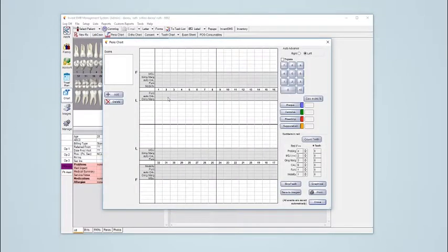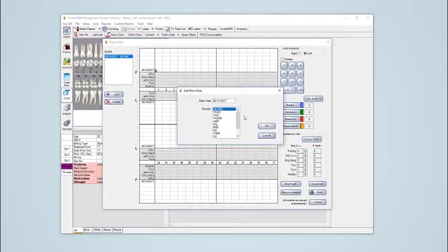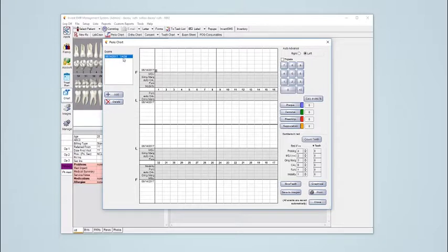I'm going to go ahead and click. On the very left hand side, you've got this box that will have the examination dates. So if you click on this, it will give you the date in which the first periodontal examination is taking place. You can change the provider by double clicking on the date. So I'm going to go ahead and change the provider name to this doctor. Each doctor will do the reading possibly in a different day in a typical scenario.